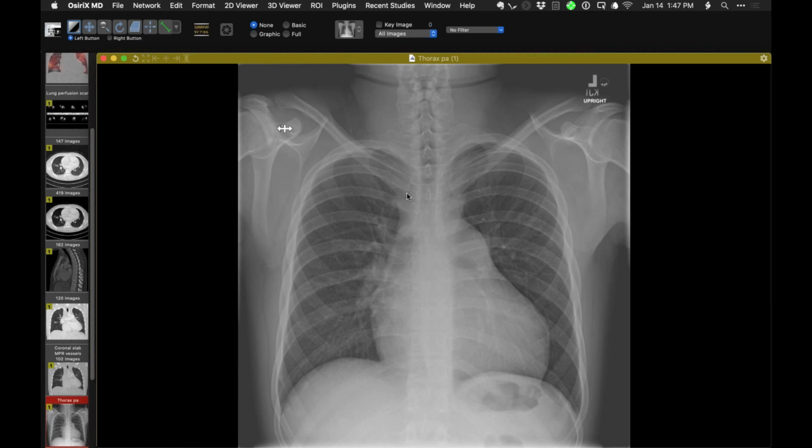This one I actually want to sort of go back, particularly if there are trainees watching today or viewing the video, to Pathophysiology 101. In reviewing a case like this with a resident, they will readily and correctly make a diagnosis of pulmonary vascular hypertension, mention the enlarged main pulmonary artery, make note of the enlarged right cardiac chambers, maybe note distension of the azygous vein, SVC, elevated CVP, and then stop.